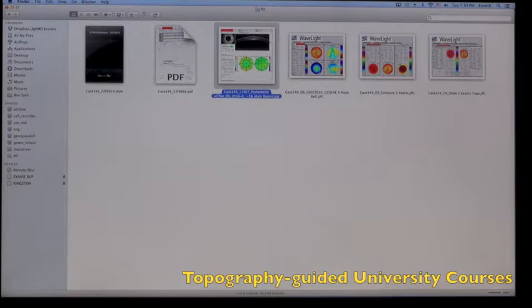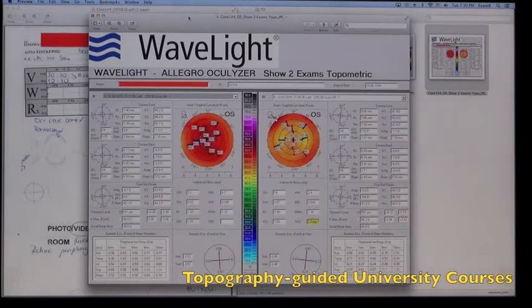And then we have a post-op pentacam map, and then a comparison of the pre and post pentacam, again in sagittal anterior segment curvature. And let's click on the topometric indices, which is the last picture on the right. Here, the topometric indices, paying more attention to the IHD, index of high decentration, before and after surgery, as a means of documenting normality of the cornea.